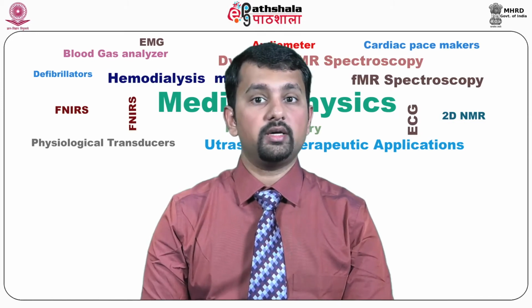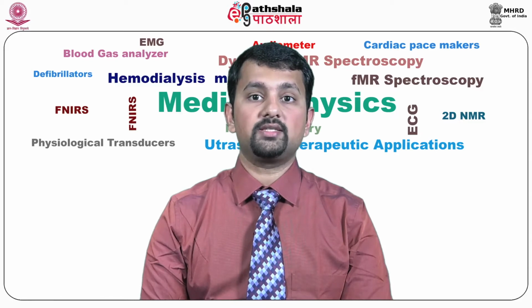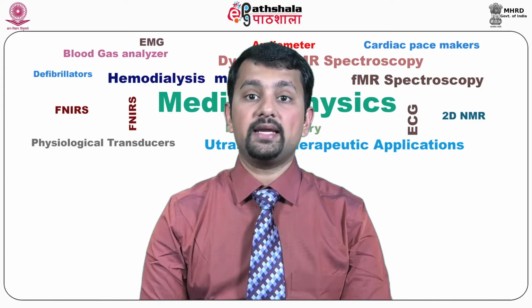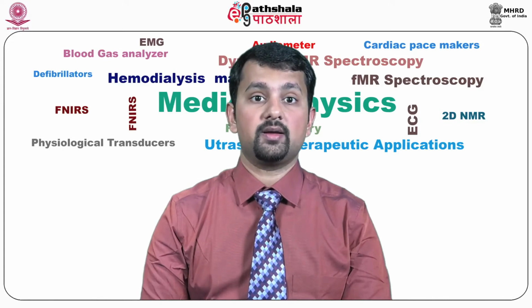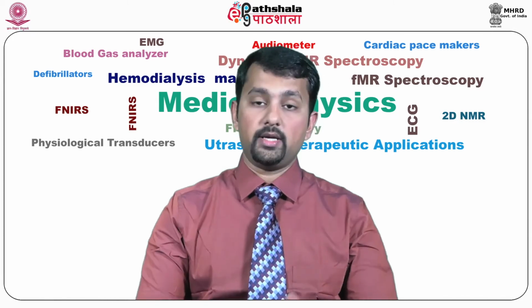The detection of increased peritumoral choline NAA ratio reflects tumor invasiveness and can be used to differentiate high-grade gliomas from brain metastasis, which exhibit a near normal spectrum in the peritumoral region.